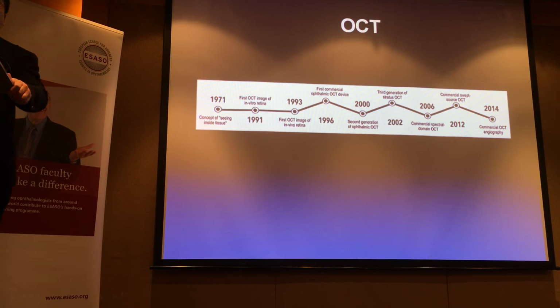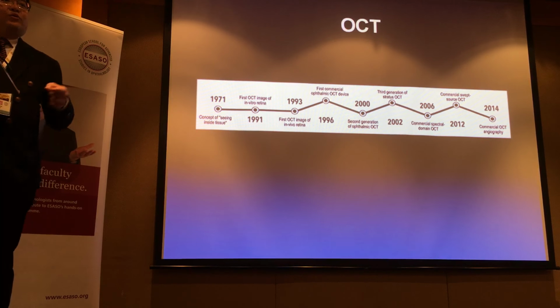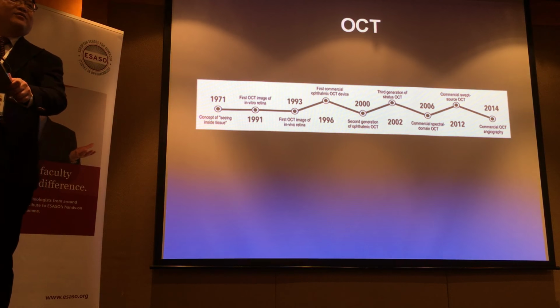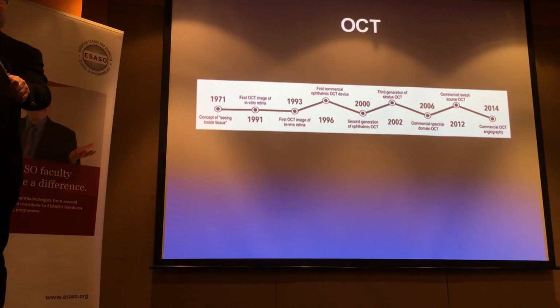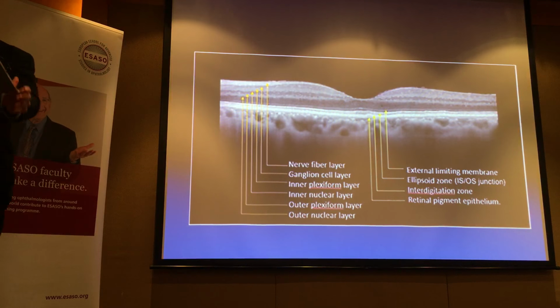Whereas once we used OCT just as something to look at and just one value, all right? I remember our clinical notes going, retinal thickness 350, arrow 325, decrease, plan, improving, assessment improving, plan, whatever, all right? That's quite different from what we do nowadays. So with current spectral domain OCTs and of course swept source, we can see all the various layers of the retina. Much better certainly than time domain, and better than clinical examination in some ways as well.